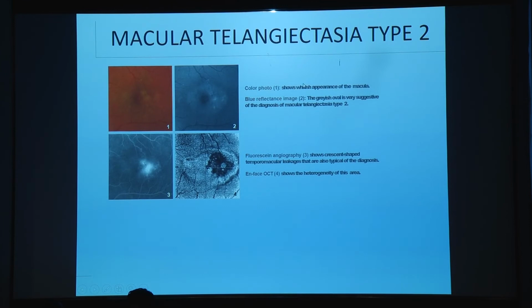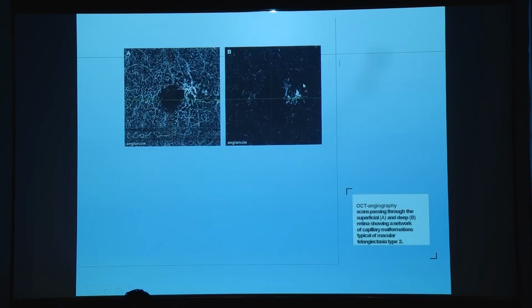Again, in macular telangiectasia, we can pick up the abnormal telangiectatic blood vessels in the area close to the foveal avascular zone, very typical of MACTEL. And these patients are also prone to develop a CNVM more at the later stage of the disease. So this can help in picking up the disease early, and the patients will have a good vision usually in such cases because it is parafoveal. Patients would maintain a 6/9, 6/12 vision, and if we can pick up the CNVM complexes and treat them early, we can help in preserving the vision in a lot of cases.